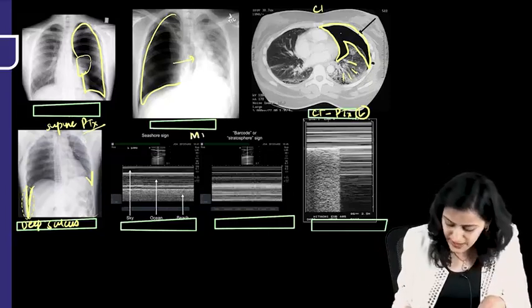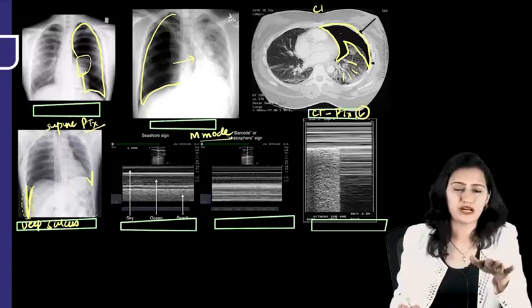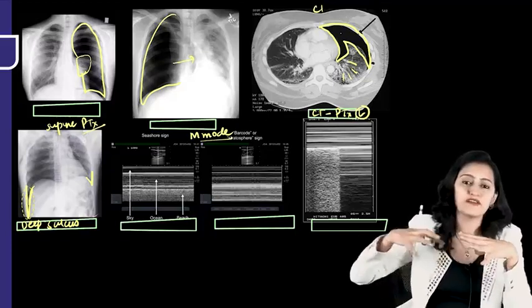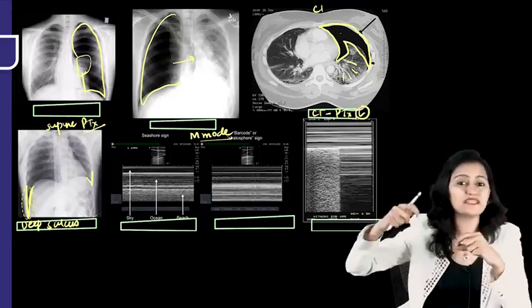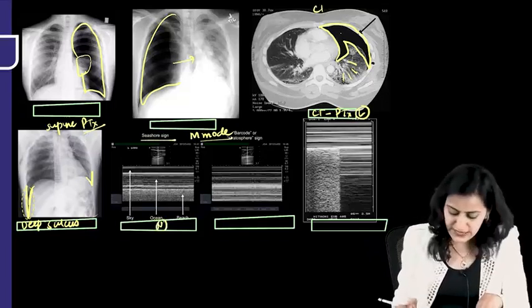Now this is the M mode of ultrasound, right? The M mode, which is done for the movement of these structures. Normal lung without any pneumothorax. We will be able to see the movement of the lung with each breath, right? So that gives the granular appearance, like a beach appearance. So that is called the seashore sign. So seashore sign is normal.